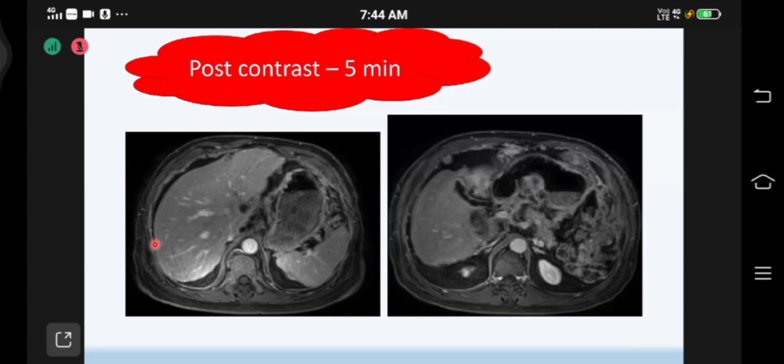that is, peritoneal surface malignancies, right? And you can see it nicely here. There is one more nodular deposit here. So it is very easy for us to also measure the dimensions of these nodules in these particular areas, right?